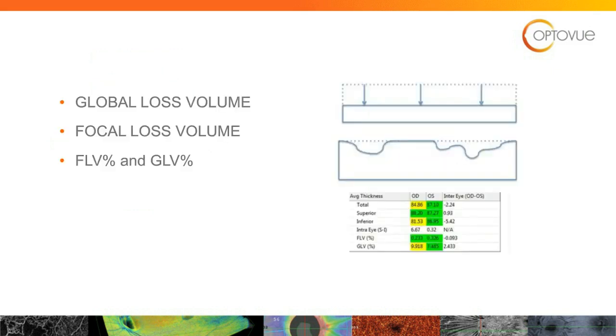So global loss volume, if we go across, we see the picture in the top right. That is when the ganglion cell complex is being lost in a diffuse kind of way. The focal loss volume is, as the name implies, being lost in a focal kind of way. So those are two graphic representations of what GLV and FLV mean. And then as we look down at the bottom right-hand part of our slide, we can see, again, the FLV percentage and GLV percentage as well.